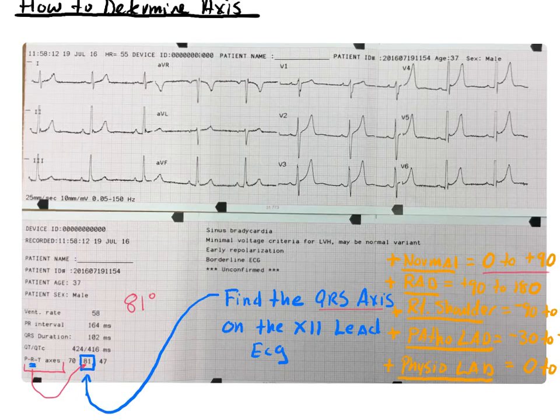Make sense? Okay, now the other way to do that is to come up here and look at your limb leads, 1, 2, and 3.